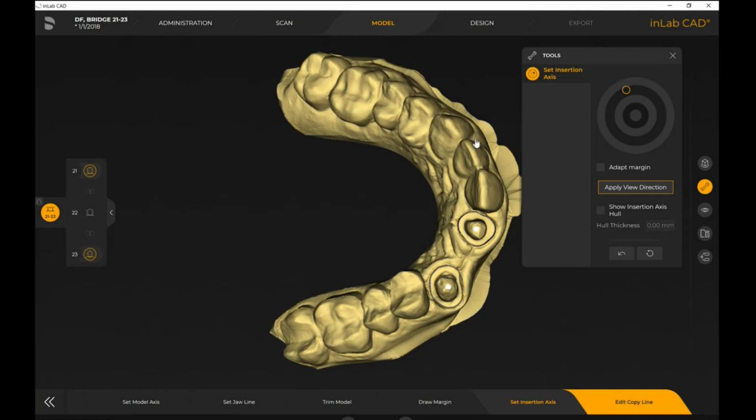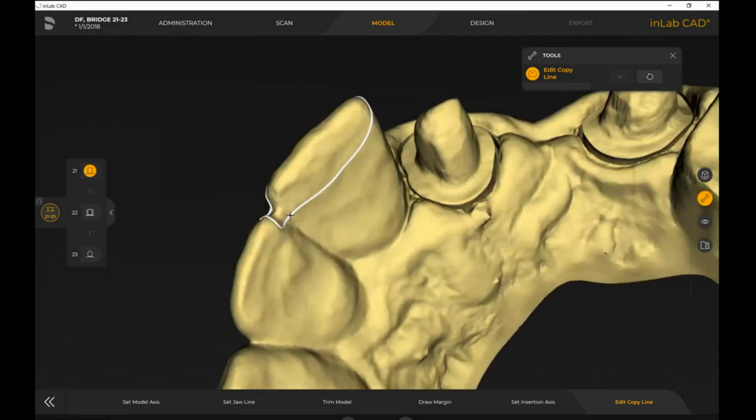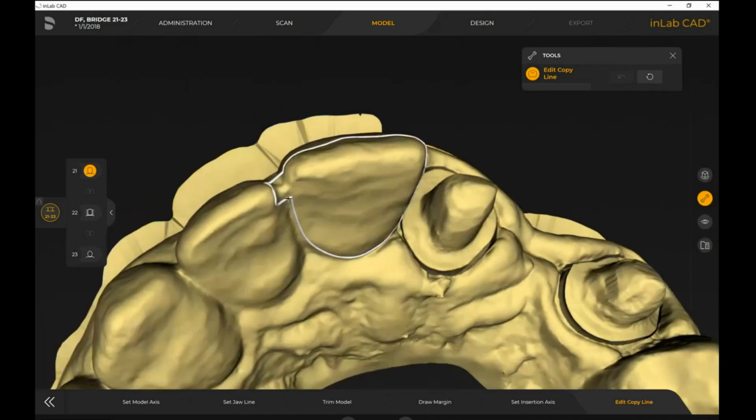And then this last step here, because I did choose copy and mirror, it's going to ask me to do a copy line for those 3 individual teeth for this particular bridge in question from an adjacent perspective. So in this case, the 1-1 to the 1-3. So you can, again, edit these copy lines to determine what you specifically want to have the software propose. The same in terms of the anatomy details.